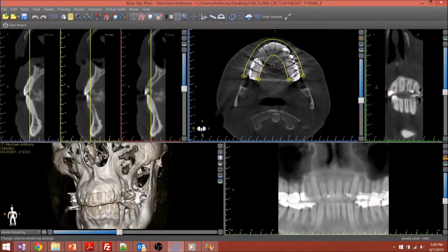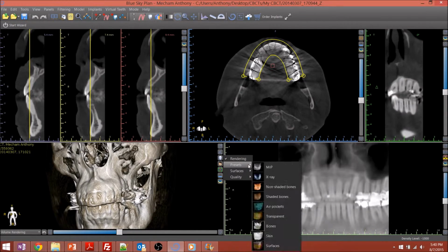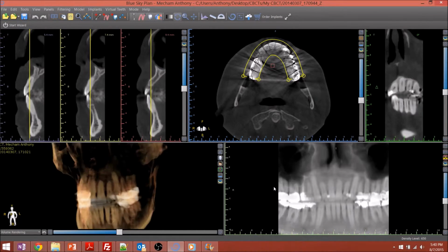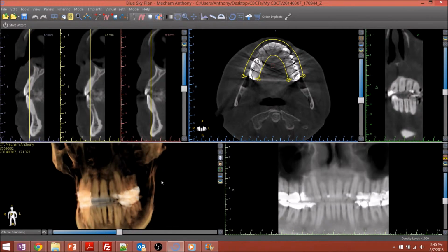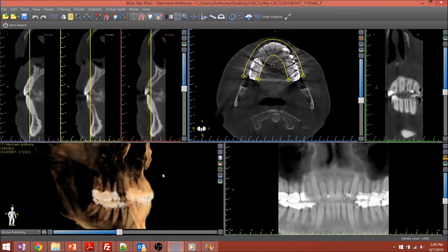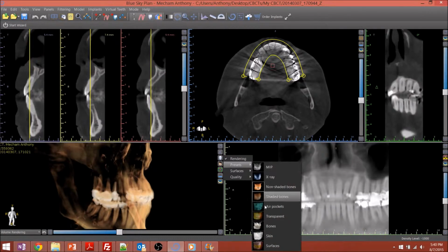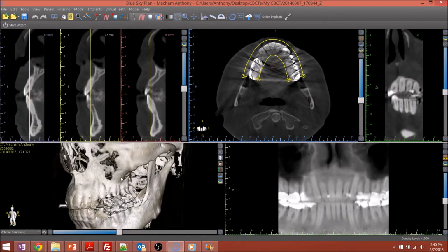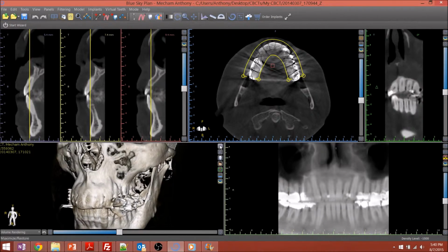You have a few more options in the 3D window, the 3D rendering. You have some presets. Let's look at our MIP. That looks pretty nice. That reminds me of Anatomage. If we turn that up to high, and then we'll really challenge our video card. But it looks better. Let's look at the bone. Okay, yeah, that looks pretty nice. Once I turn that setting up to high, the 3D rendering looked a lot better. And you can blow that up.